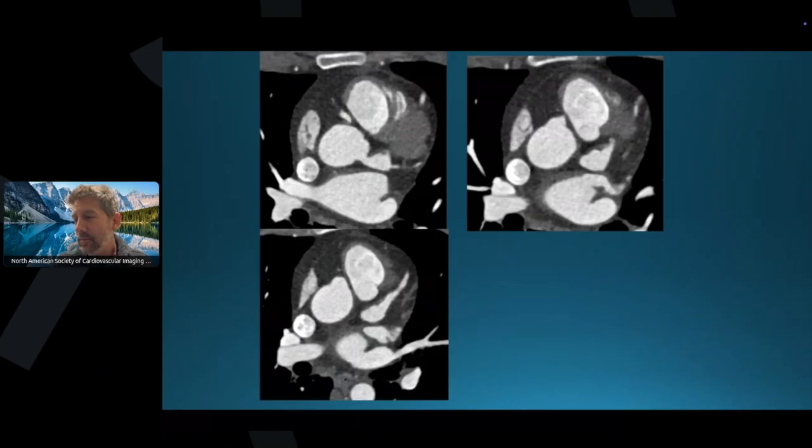The proximal coronary arteries are large-sized, aneurysmal. The LAD and maybe the origin of the RCA is also dilated. So I'm thinking of a process that caused aneurysms of the coronary arteries at age 40, maybe vasculitis or prior Kawasaki. Yeah, exactly, that's exactly right.